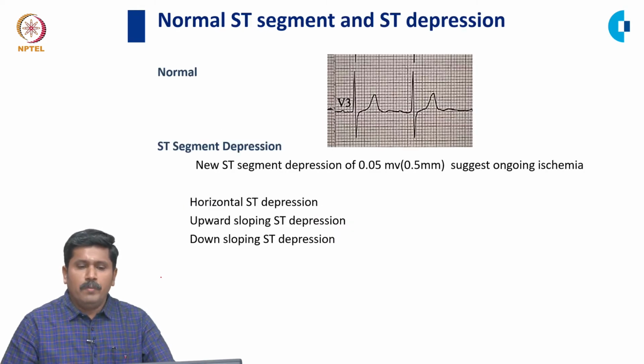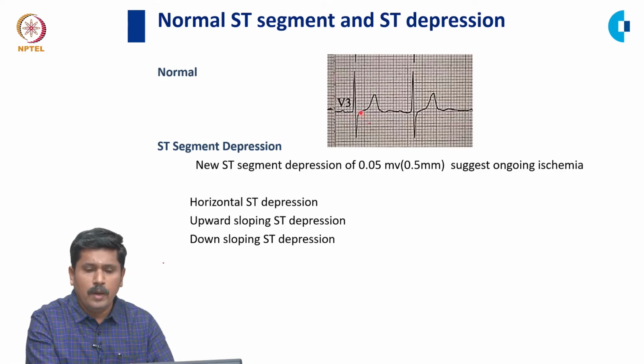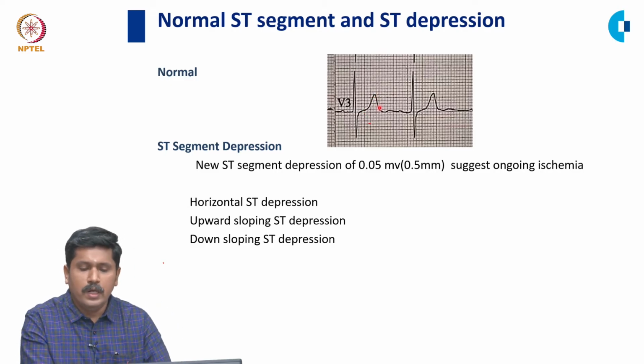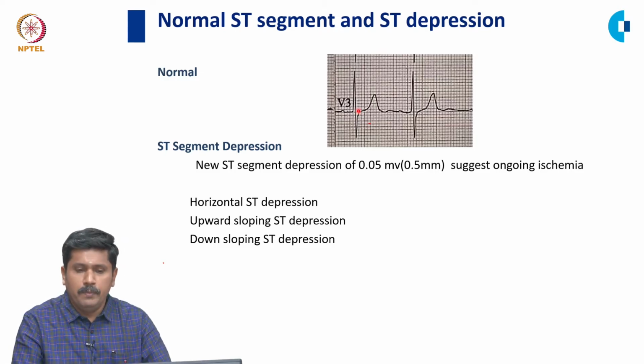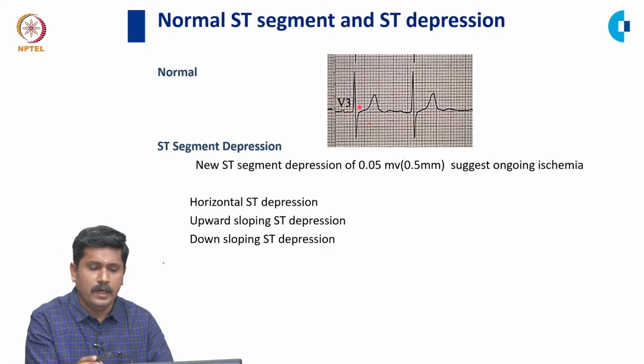So, what is a normal ST segment? The normal ST segment usually arises as a low amplitude wave that then merges with a larger T wave. The polarity of the ST-T wave is similar to the net polarity of the QRS complexes. The origin of this ST-T wave is called the J point, and that is where one measures the elevation or depression with respect to the isoelectric point, which is the PR segment. Here is the PR segment.